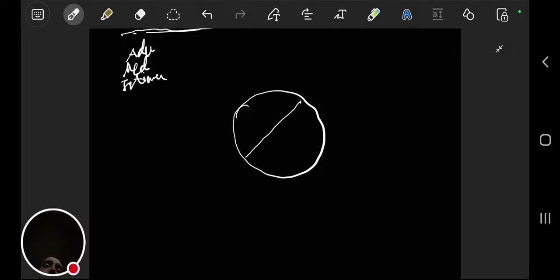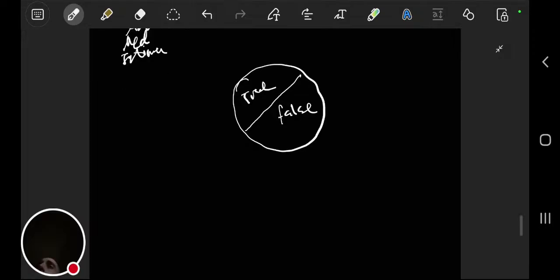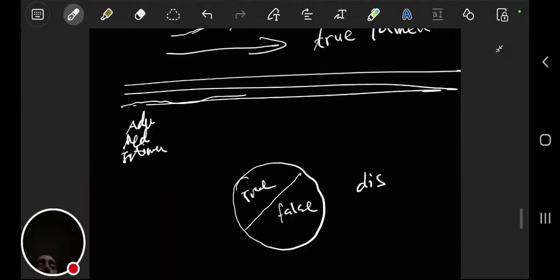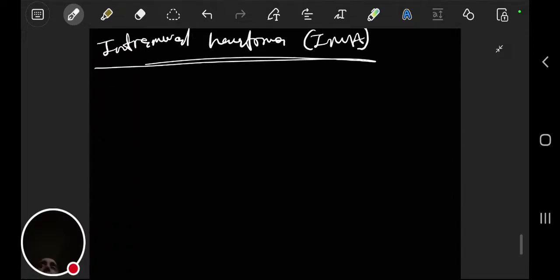I may see, for example, a flap that separates the aorta between the false lumen right over here and the true lumen right over here. It depends on where the lesion is and where the blood happens to be. But you can see this flap that separates the true lumen from the false lumen in aortic dissection. And this is important because it will be different in intramural hematoma.